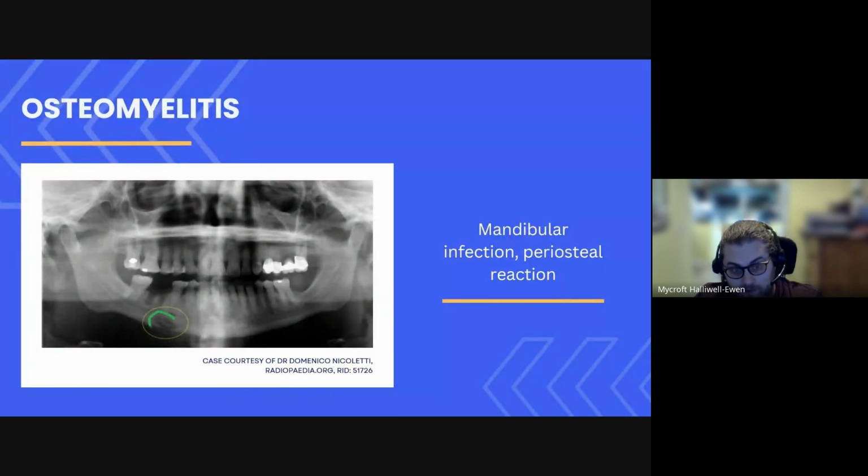We can see there's some lucency, so we've got some destruction of bone, so a destructive process. You can just see the periosteum, yeah, just being lifted off the bone. Same osteomyelitis, same as everywhere, right? You can see destruction, right? We know it's not a fracture because the fracture would tend to go all the way through, and it wouldn't tend to give us this lucency. It would just give us a nice clean fracture, whereas this is some sort of destructive lesion.